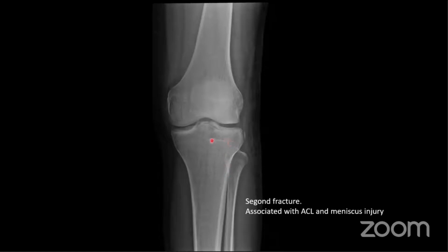I think that is the remnant of the growth plate. Back to my first point, you want to look at the lateral view to make sure the fibula head isn't injured. But I think on this frontal view, that's just overlapping between the tibia and the fibula. But yes, I agree, you would want to look at this on the lateral view to make sure there isn't a fracture here.